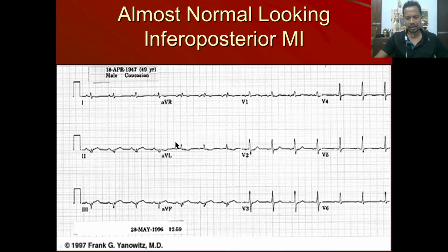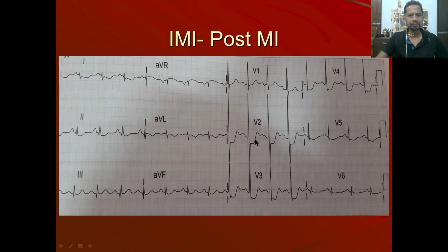Sometimes you will get dazed after looking at 10 or 15 ECGs. By the 16th ECG you will just glance at it like that. That is where you will make mistakes. I can actually see coving out here also, and tall R in V1, V2. So this is posterior wall MI.